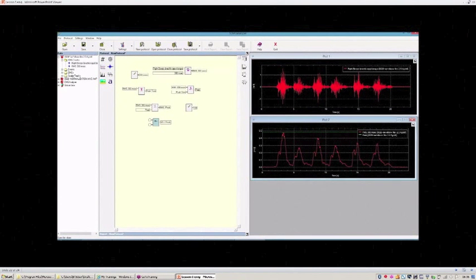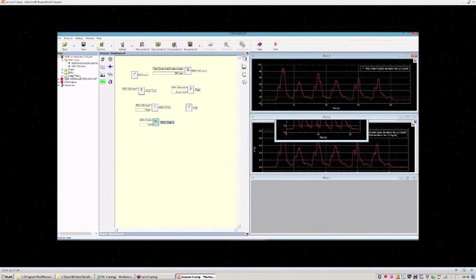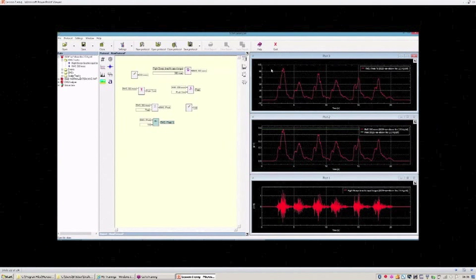The division multiplied by 100, and that is the result. So now, as you can see, we have changed the scale of the y-axis amplitude to go from 0 up to 100.